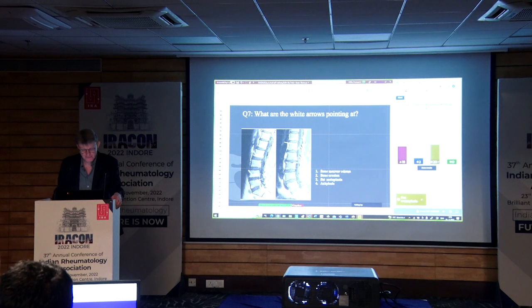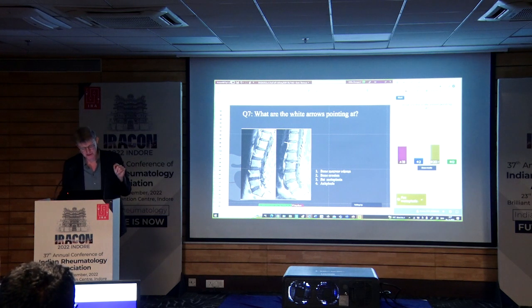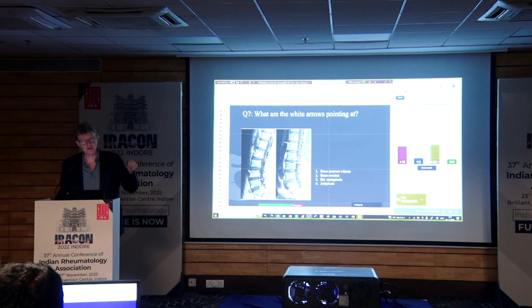So the fact that the water here is dark shows you that this can't be water, because water has the same color both here. It's dark here and white here. That doesn't make sense. So it's dark here, and what is then bright here, that's fat, as also the majority said. But that's important. Always find out first which sequence you are looking at, and then you find out what pathology you have, because if not, you make mistakes quite often. So that's fat.